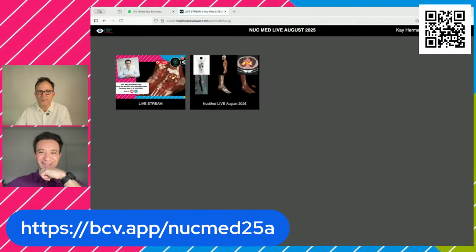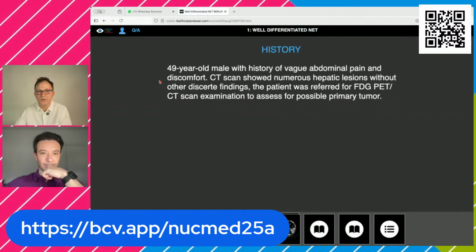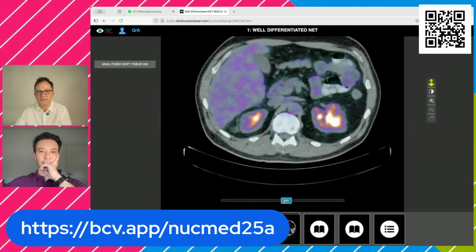So if you are here with the live stream, and these are the cases, you click on the second tile, you have the cases here, and you see we have prepared 5 or 6 cases. We don't know if time is giving us a chance to see all of them. You go to the case, you can mostly see the history. You can click through the cases and scroll through and try to analyze.